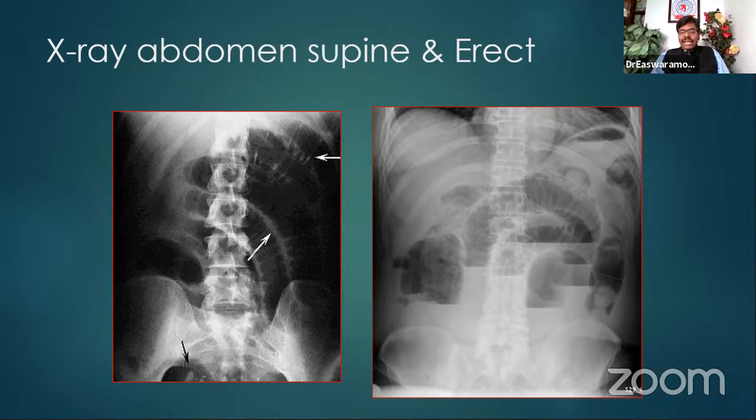But what is strikingly absent is the large bowel shadows, which are not very clearly seen, even though there is a confused shadow, a fecal shadow, but I think it is predominantly small bowel. I put the money on distal small bowel adhesion. Any patient with a previous history of laparotomy, whatever may be the cause of the laparotomy, is an adhesive small bowel obstruction, probably ileum, because of multiple levels.